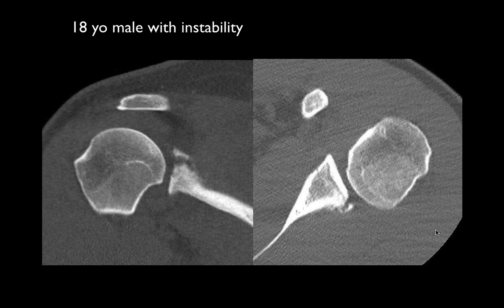This patient has very well developed musculature here. I'm not sure whether the patient has that or whether they just have a congenital retroverted glenoid, and the patient had repeated posterior instability events, being an athlete. I don't remember that part of the history. Yes? Just based on the CT and even the MR, can you tell for sure that there wasn't a prior posterior dislocation with an old fracture? I mean, how can you tell the difference?